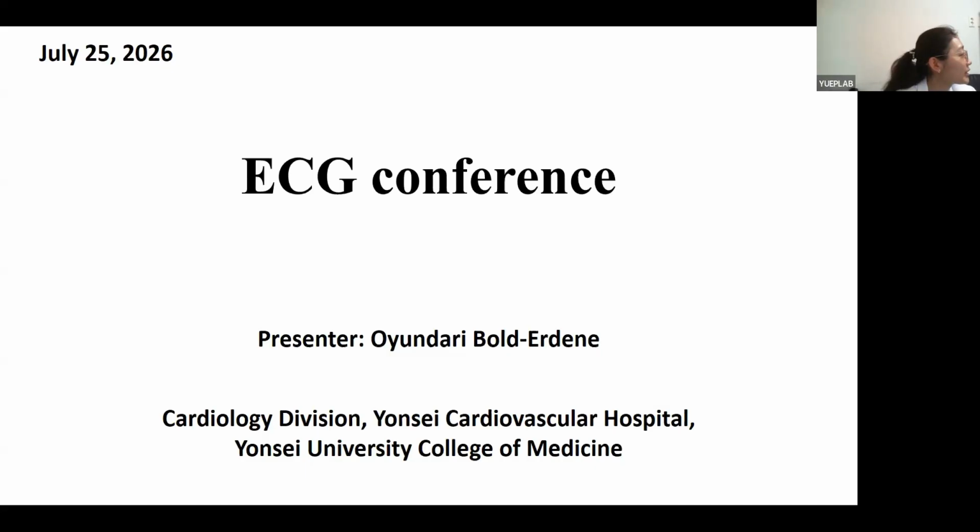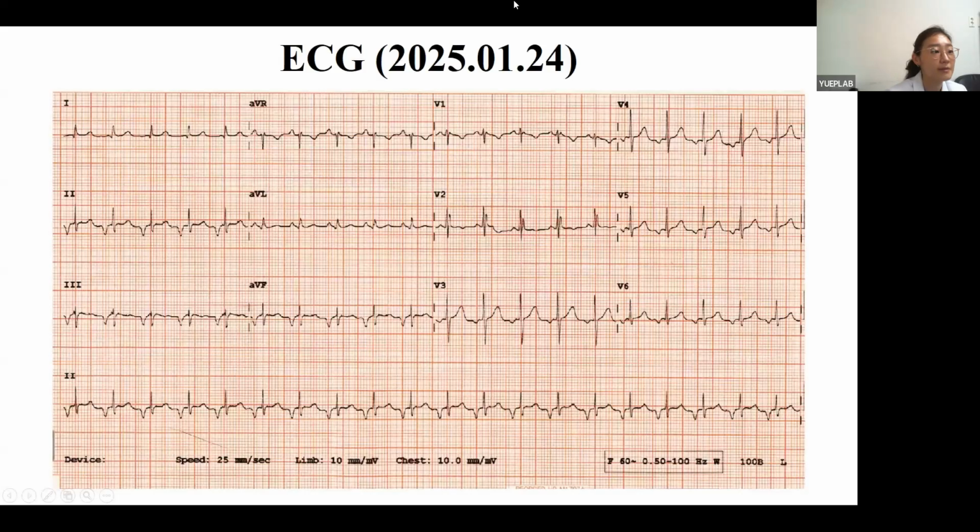Today, I would like to present this ECG for discussion. This is some of this ECG. Is that the part? Okay, good.